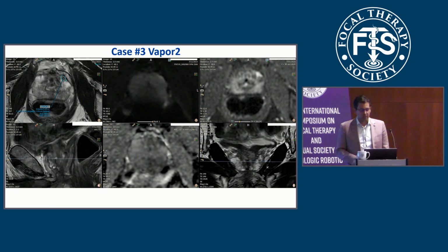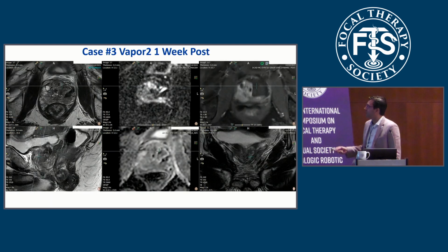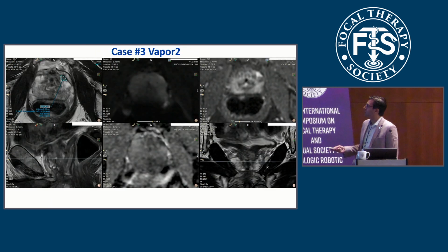All right, we have a left anterior small focal lesion located here, high signal in the DWI, focal enhancement, and you can see the cross axis. It's somewhat clear over here. You can see a focal lesion.